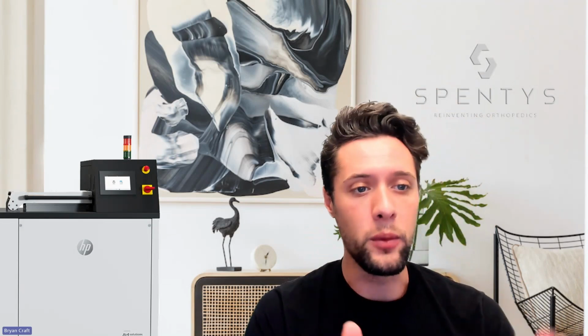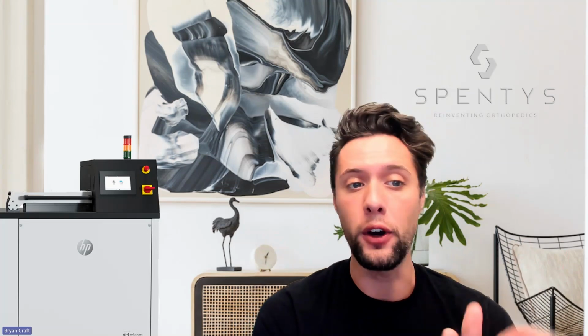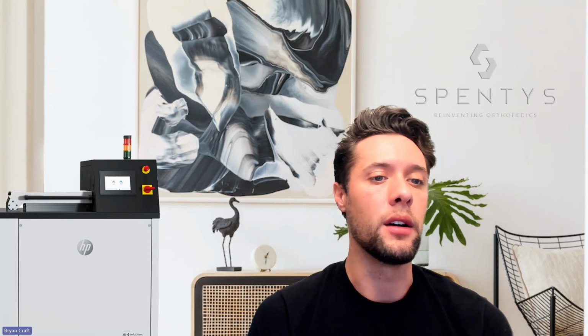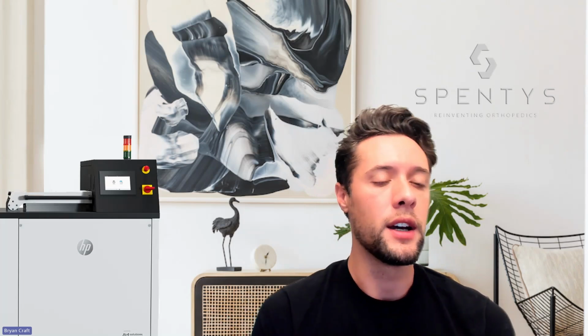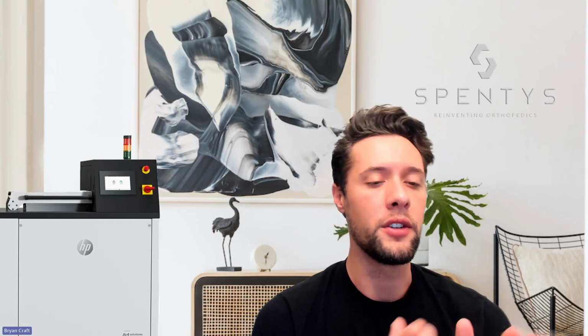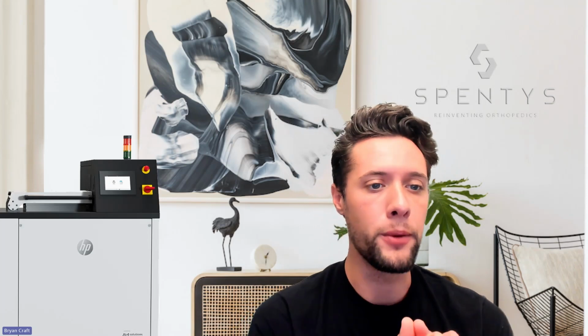Now you could take this mold and you could 3D print it, fill it with sand or plaster to then vacuum form over for an AFO, or you could then carve it if you'd like, importing it into a carver and then cutting away from foam material to get to your shape. Now you may need a sacrificial layer on top of the mold before you thermoform if you're going with foam.